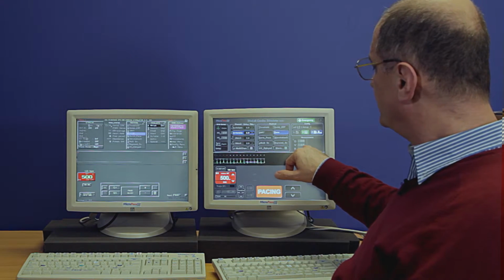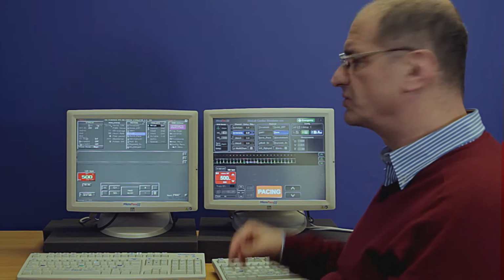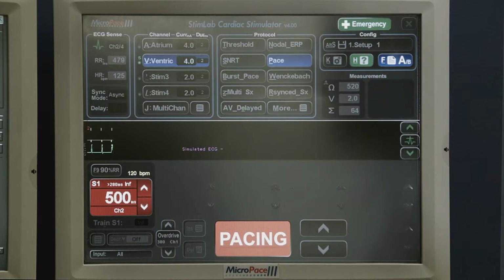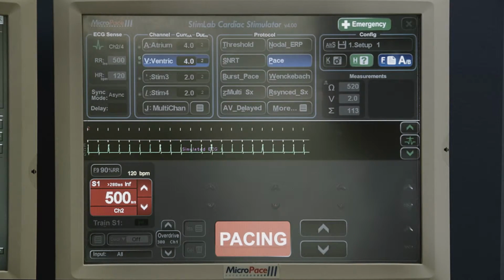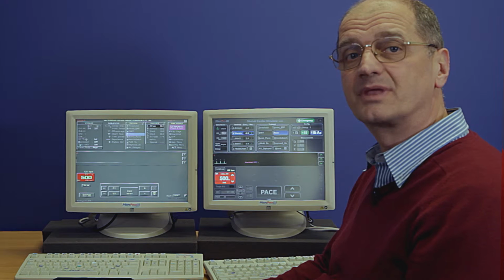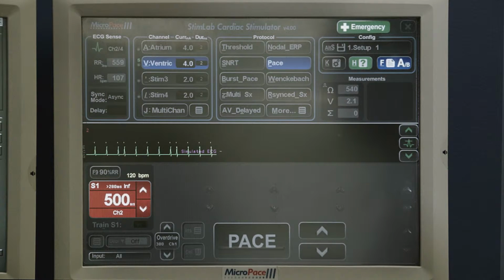We also display the voltage that the stimulator has issued to generate the 4 milliamp current. This voltage is useful for markets such as China and Japan, where cardiologists are used to stimulating with voltage-controlled stimulators. You can't set this voltage, but knowing what the voltage is assists the cardiologists in these markets to understand the functioning of the stimulator.